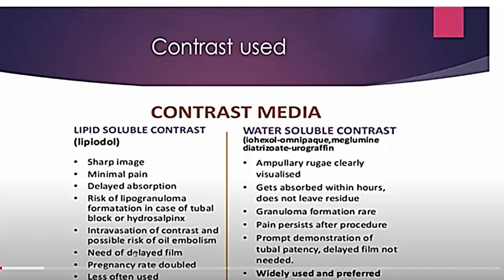With the lipid-soluble contrast, we need a delayed film after 24 hours. But here we do the control film after 15 to 20 minutes only. The water-soluble contrast is widely used and preferred because, as I just said, the lipid-soluble contrast is not available. The pregnancy rate is doubled with the oil-soluble contrast.